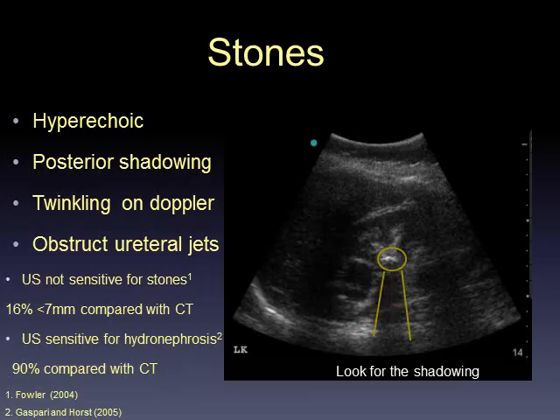Just put a note there to point out that, again, ultrasound is not very sensitive for looking at stones, in particular smaller stones. Whether this matters, whether these are clinically significant stones, is for another discussion. But just important to note that it's not so good for stones, but it's very good at looking for the hydronephrosis that stones can cause.